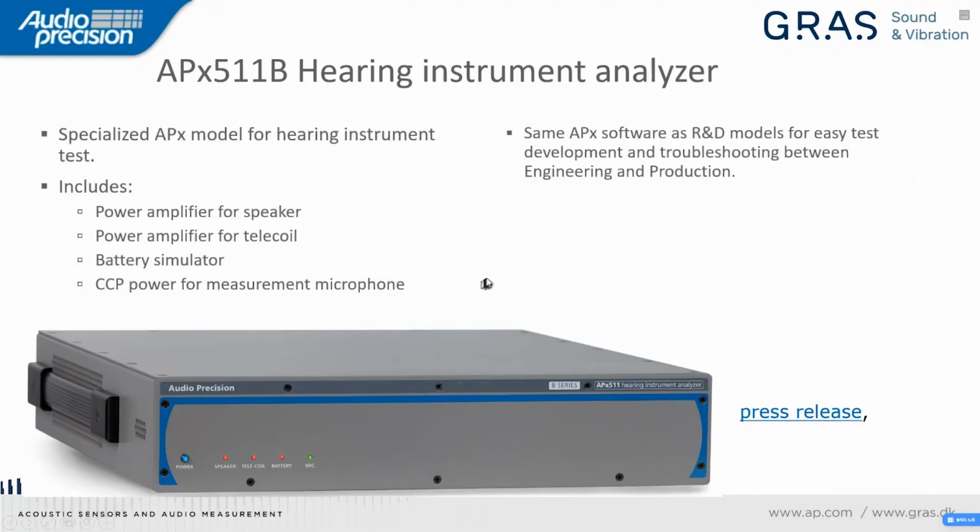Now this uses the same APX software as our audio analyzers, used for R&D. And this allows for easy test development and troubleshooting between engineering and production. It has fast measurements, high performance, and very flexible software.